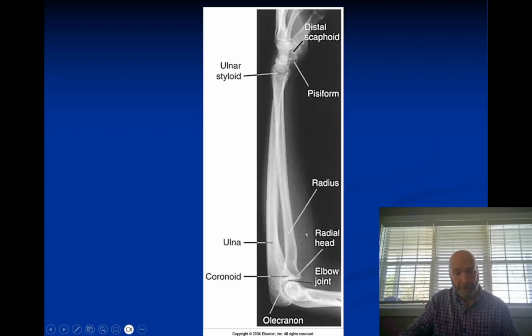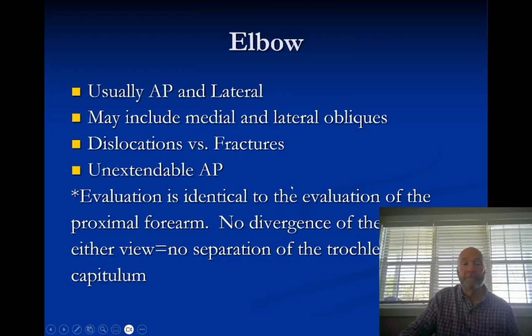So, pretty good lateral forearm. Again, you just don't see the characteristic appearance of the proximal end, those two condyles stacked on top of each other really well. Because of the divergence of the central ray, it's just not a good image of either the wrist or the elbow. But that's not what we're looking for in this case. We're looking for the forearm itself. So I'm going to pull up there, and we'll pick up with the next one at elbow.